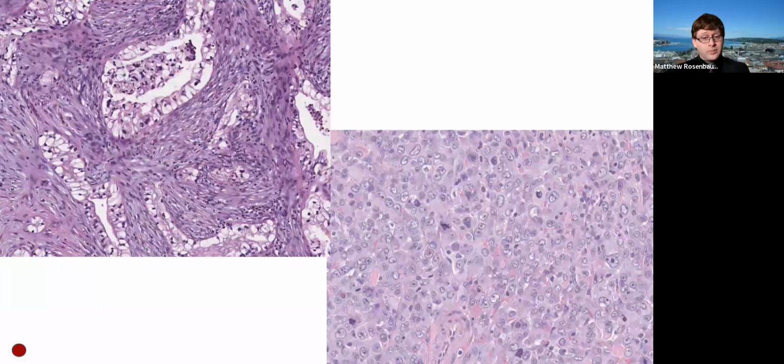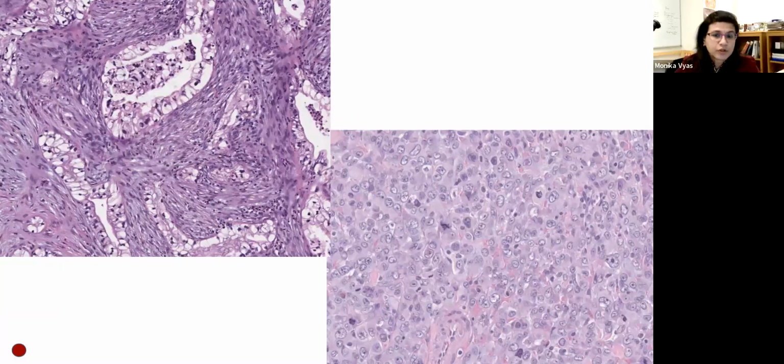But again, you have a lot of morphologic variants, and the most common one that we see in practice is the foamy gland variant. You just saw cytology of that. And here's an example of histology from a similar case. So you can see these glands have a very clear epithelial lining, and oftentimes the nuclei are very small. Sometimes they're even squished close to the base.